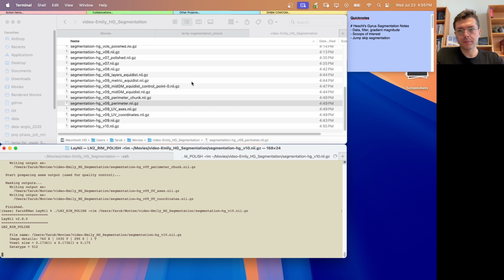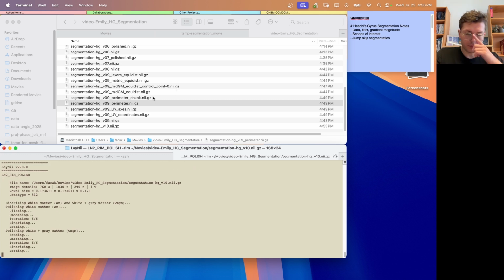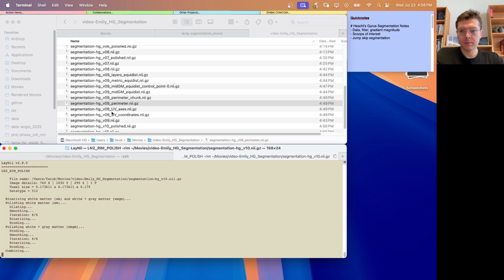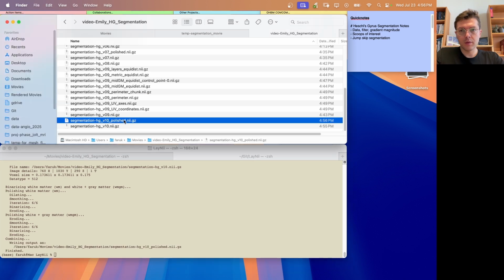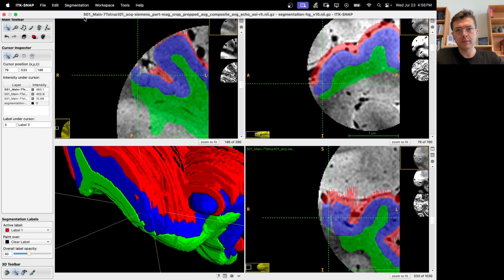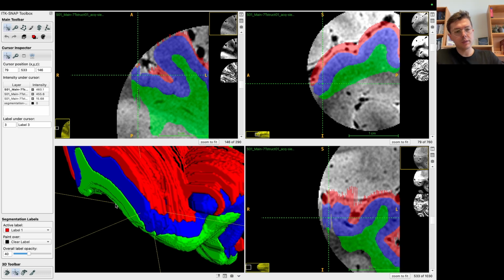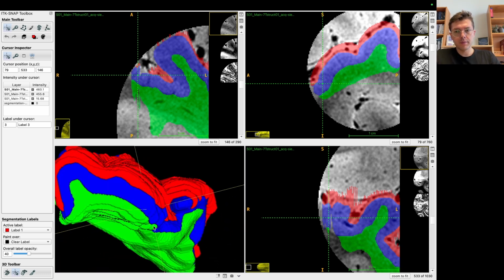So let's see. Okay, polished. Let's call it 11. Let's check this. It's smoother as you see. That's what we want.